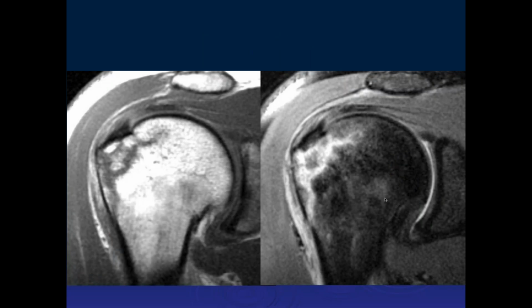Okay. Thomas, is this yours? Yes, so the supraspinatus looks like it's intact. There's a little bit of thickening of the subacromial subdeltoid bursa, and then there's some edema at the greater tuberosity, and I'm not seeing any cortical disruption. Well, I wouldn't say no cortical disruption. I think the abnormal signal goes up to the cortex.